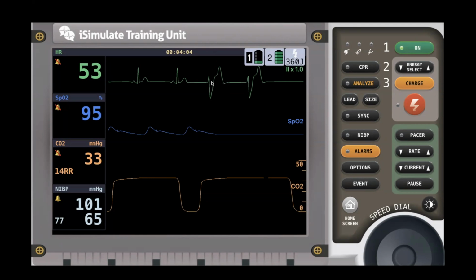And these may or may not perfuse. In this instance, these do not have a pleth with them, so they're not perfusing. That's a problem because then this number is not accurate. This is electrical impulse pulse rate. It also needs to correlate with SpO2 pleth pulse rate.